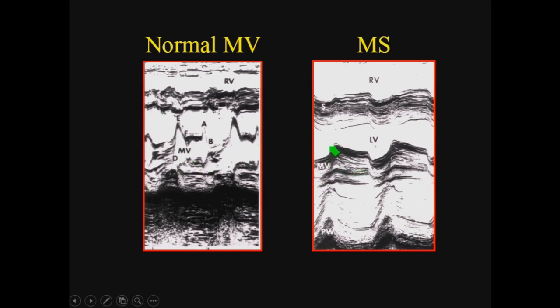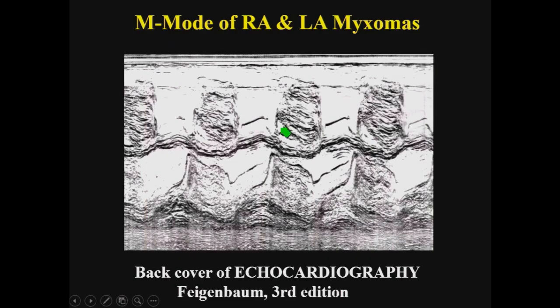And also, because once the mitral valve is opened, there is gradient across the valve, and therefore it never floats back toward the closed position, and therefore you don't have this decline, right? And you have just a flat, what we call E to F slope. The E to F slope is flat, and this is all characteristic of mitral stenosis. This has very high sensitivity and specificity, and when a patient has something like that, we know that he does have significant mitral stenosis.